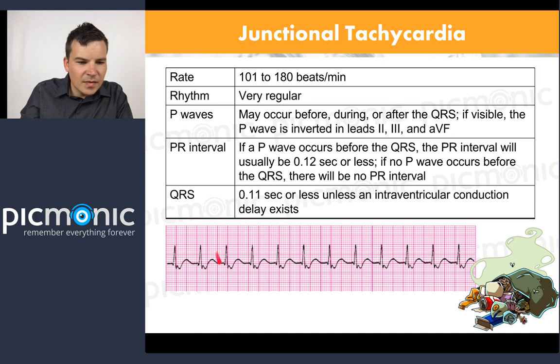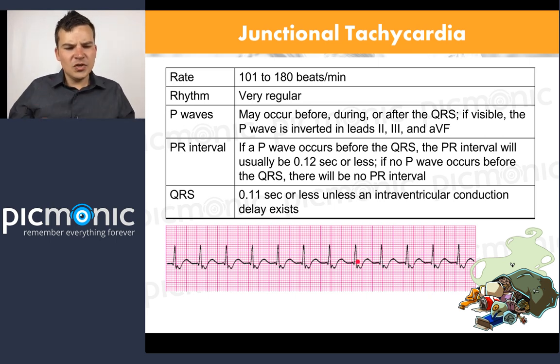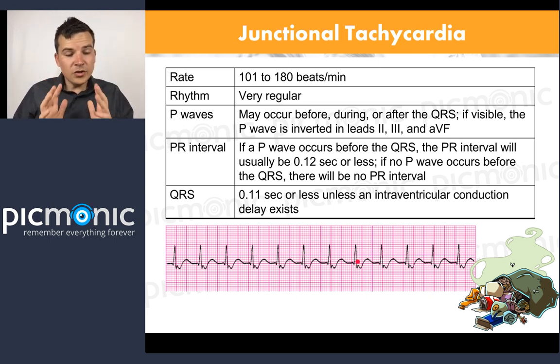What's this? There's no P. That's not the P. That's over here. So we're looking at PQRST, and then just some madness down here, right? Actually, the P wave is occurring, this is actually the P wave down here. But when you look at these, so many people get confused and hung up, like, well, which one's the P? What you should be able to do is identify the QRS, right?